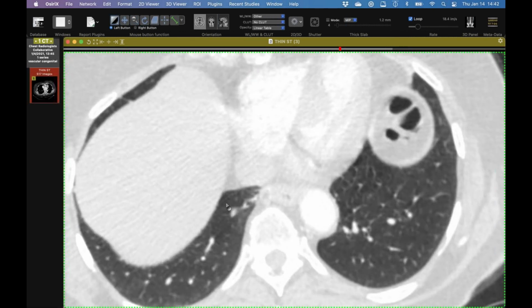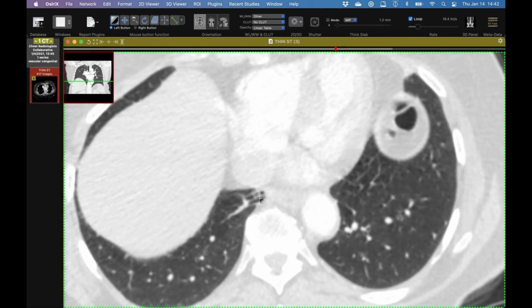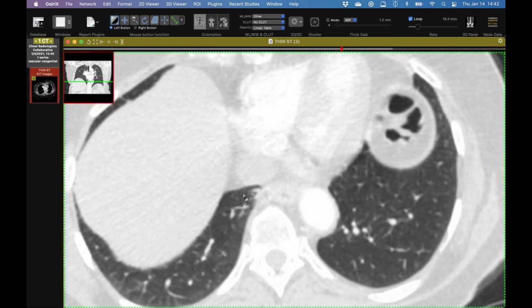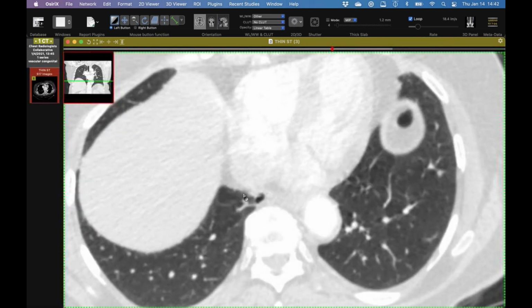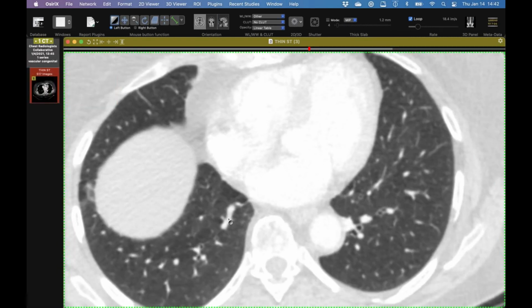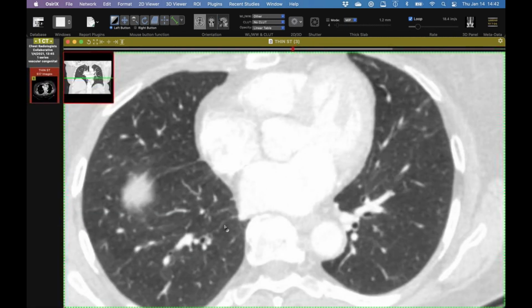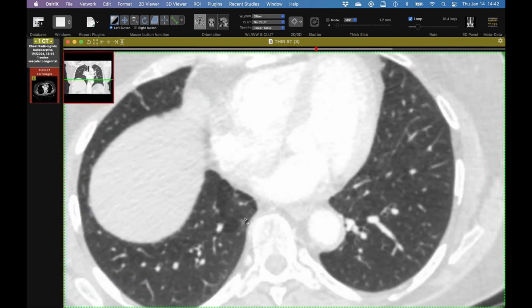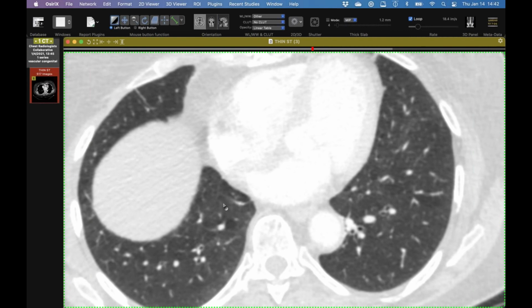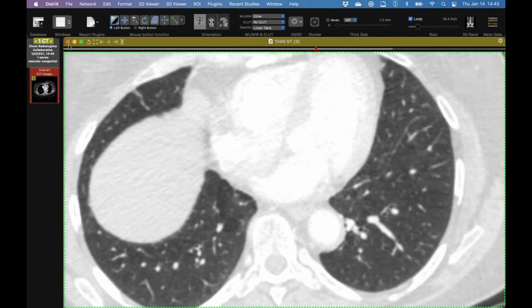But what's kind of cool is we were looking at this, and you can follow this vessel that's in the wall. Looks like it's in the wall of the esophagus here and runs up in the esophageal wall. And then there's a little branch that comes out right here into the right lung, probably in the region of the inferior pulmonary ligament there. Maybe it's a little lower, but I think this is a nice, subtle example of systemic arterial supply to just a little portion of the right lower lobe. But of course, these can be sources of hemoptysis because of the high systemic pressure. It looks like, I presume that's some bronchiectasis or something. So maybe at one point there was some bleeding, there's some scar.